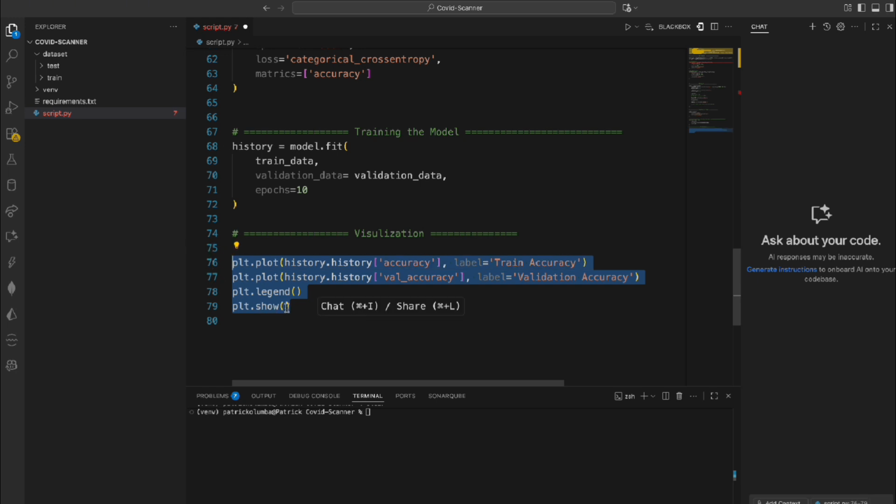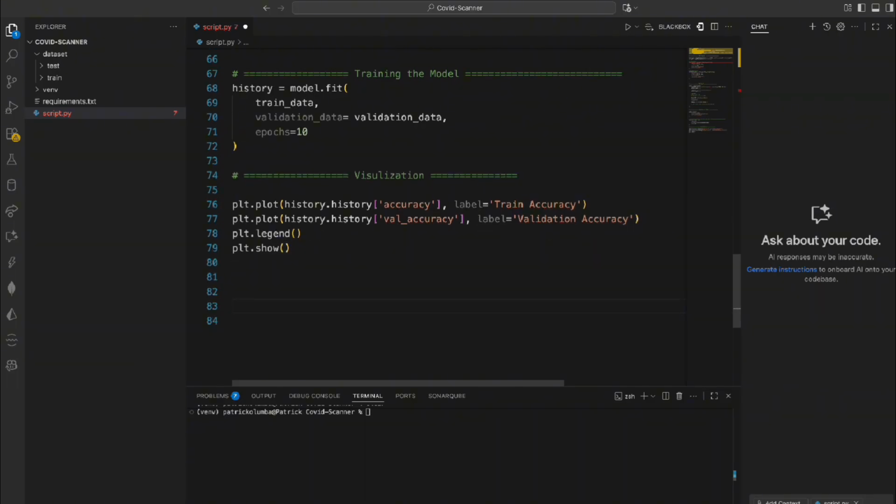So with that being said, we want to test our model right now. So voila, we're done. We just want to test it to see what's going on. I know some of you may be wondering, just these few lines of code? Yep, deep learning is not as difficult as you may think, but it might be complex sometimes when you need to do some deeper stuff. All right, so let's test it out.